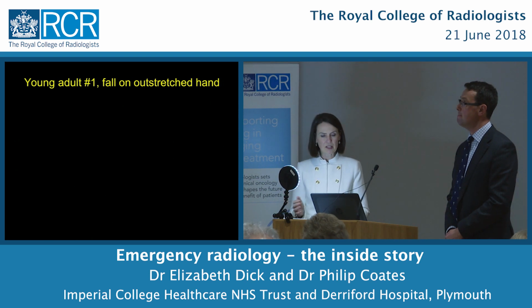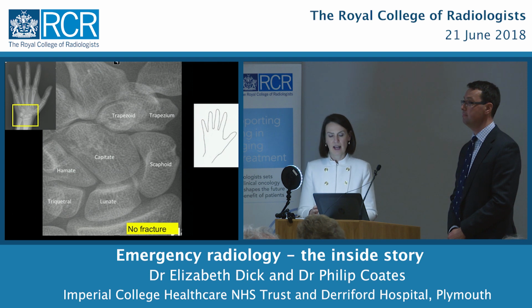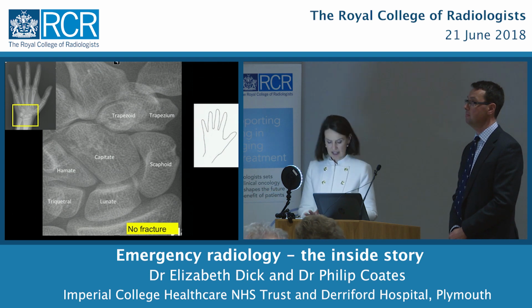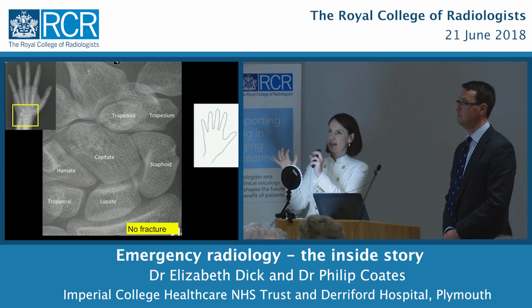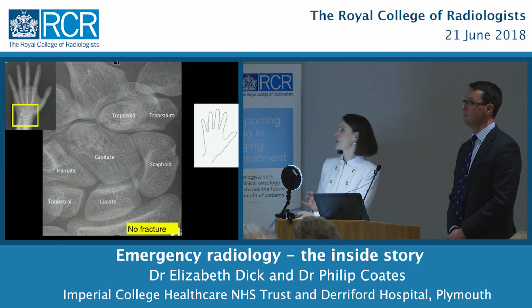So here's the first patient, and this young man has, here's his x-ray, and these are all the bones of the wrist. You can see that they kind of line up like crazy paving. And the bone that we really care about a lot is the scaphoid bone, which is this bone here.